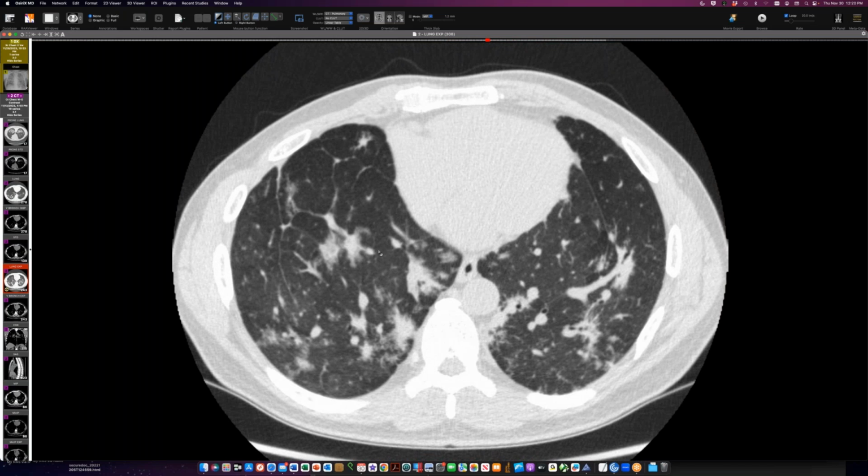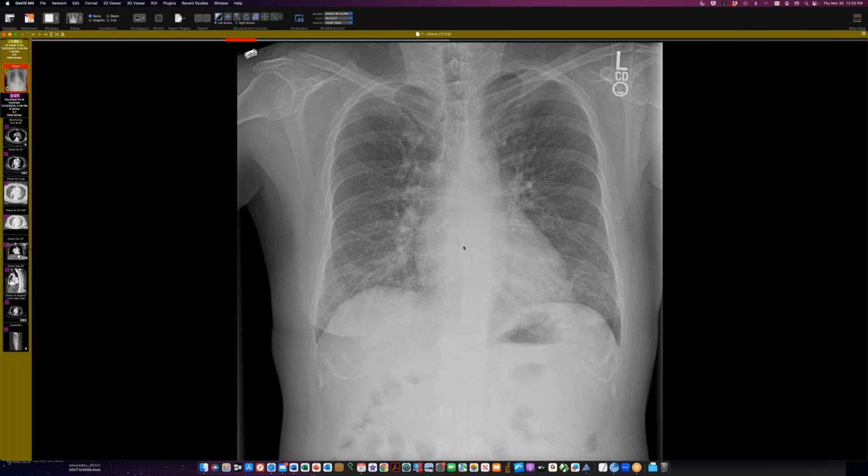Or Judd Gurney used to call the putty nodes in sarcoid this sort of vague whiteness, not dense little nuggets of calcium. Okay, so another person who is short of breath and hypoxemic is this person with chronic liver failure who has some mild basal consolidation.